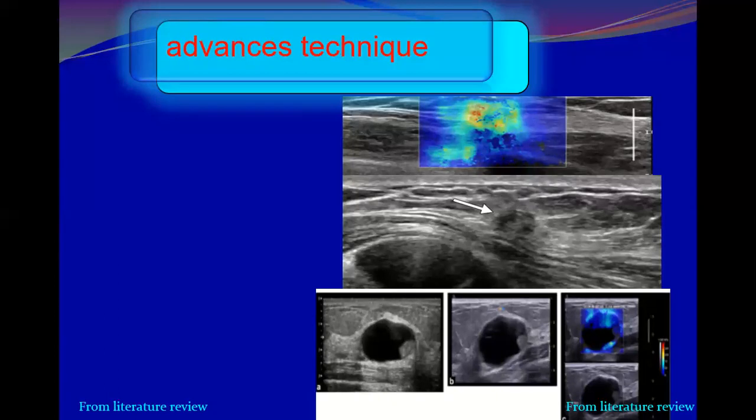In the image there is a barcode with numbers, and it's not clear, but there are numbers. Since there are numbers in the color map, we are dealing with shear wave. Excellent. Well done.